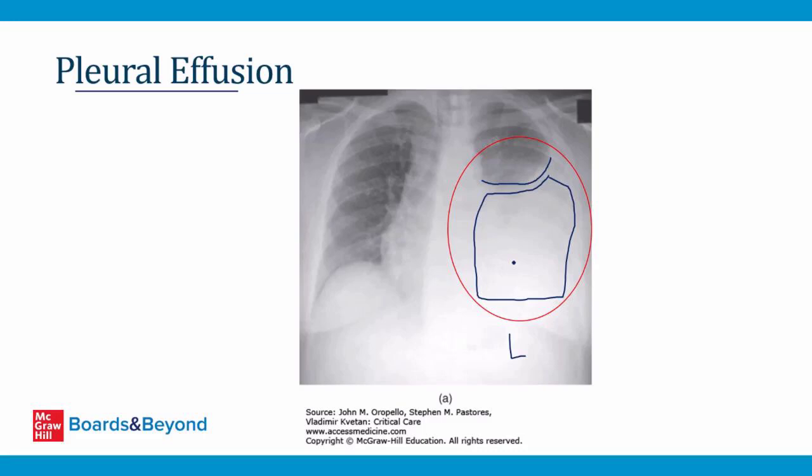Notice also that the white material isn't confined to a single lobe. That's what you might see in lobar pneumonia. But here we've got white infiltrate sort of filling up half of the lung or more, not obeying the borders of any particular lobe of the lung.